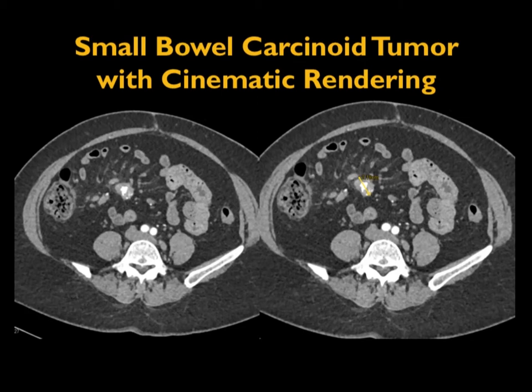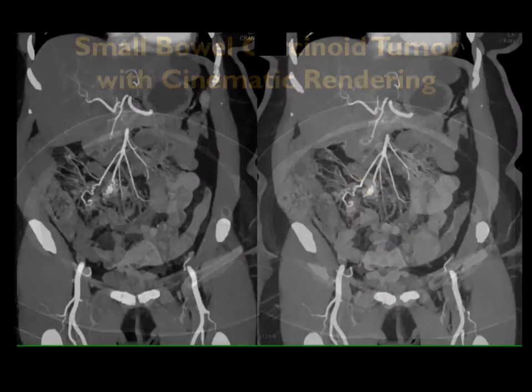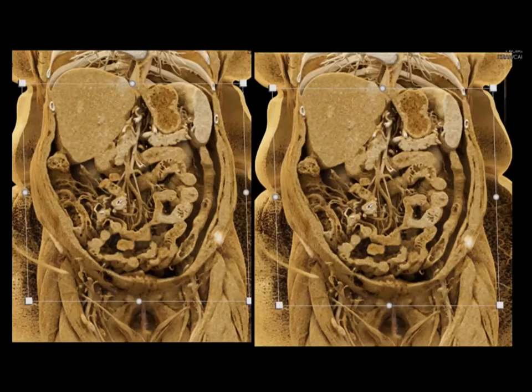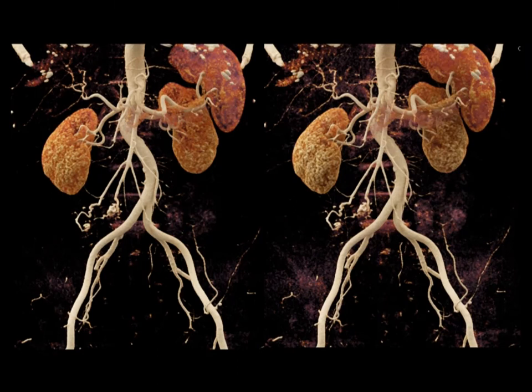The vessels are dilated. When you look at the MIP imaging, you can see on the arterial phase that there are branches of the patient's SMA. They're encased by the patient's tumor. And you can see that here as well on the cinematic rendering. Just a very nice example of the bowel involvement as well as the mesenteric vessels. And here's just a good example of just targeting onto the mesenteric vessels. So just a very nice example of being able to recognize and how cinematic rendering can be helpful.